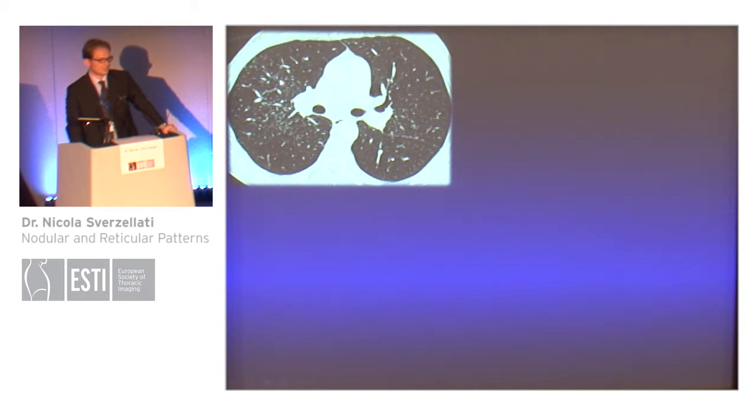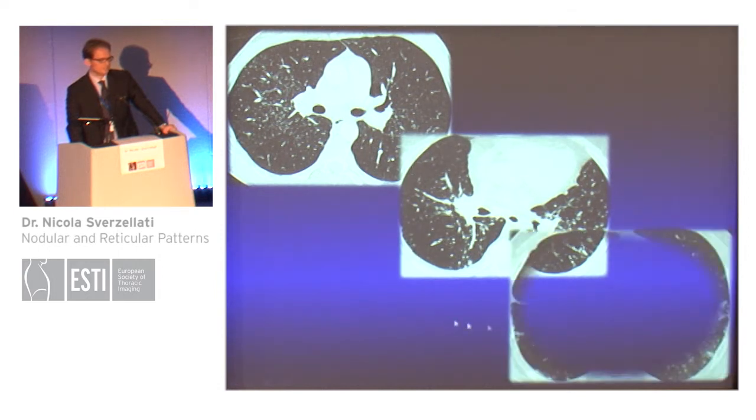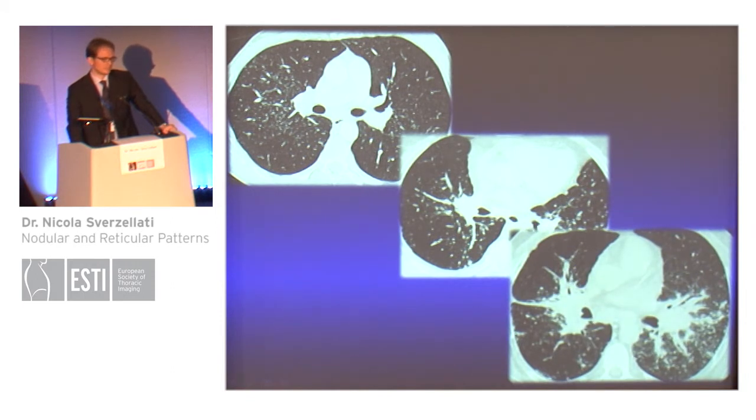nodules here are predominant in perihilar regions, and we can see centrilobular nodules, nodules involving the fissures, and in this other example, the nodules can be seen here at the periphery of the lung, touching the pleural surfaces, and quite often we can note that the central bronchovascular structures show irregular margins due to the presence of several nodules involving the interstitium enveloping the central bronchovascular structures.